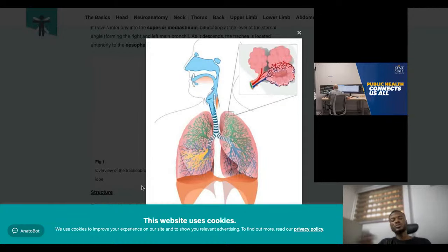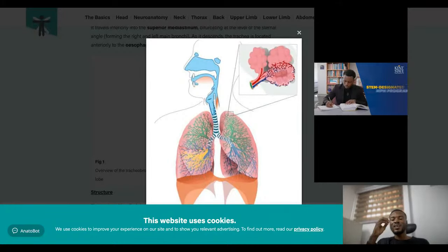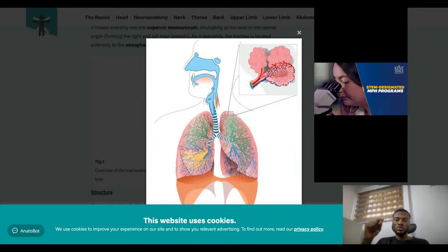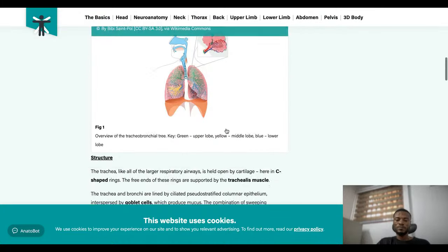Because these bronchioles, bronchi and trachea contain air, their normal radiographic appearance should be what? Radiolucent, black. So in any case, if you find some radiopacities in the lung areas, then you know that there is what? An abnormality.